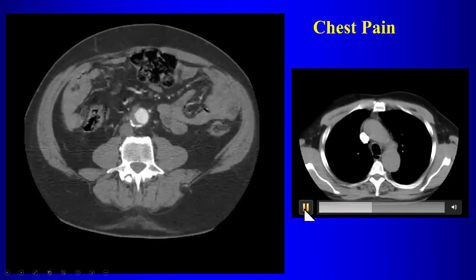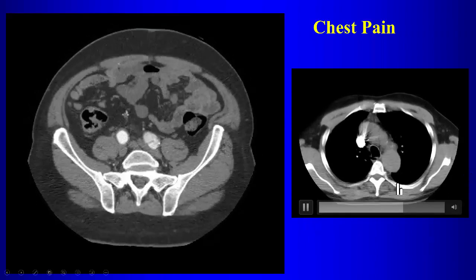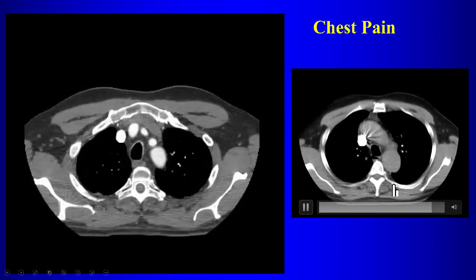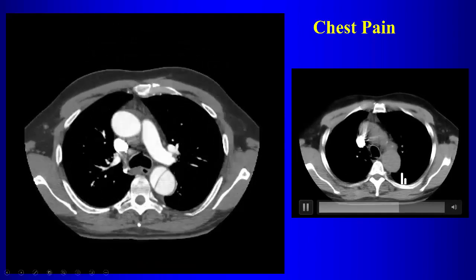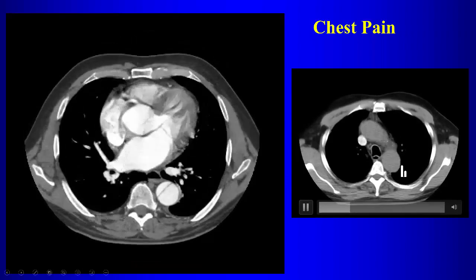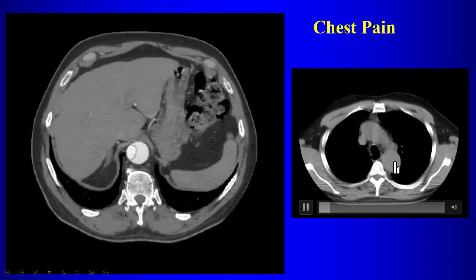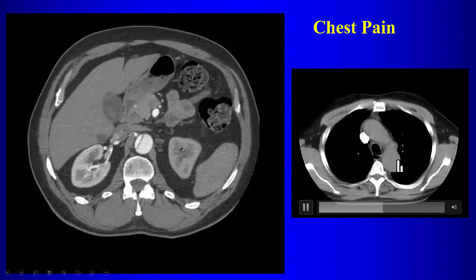Essentially, you take one slice location, you localize it, and then you decide on your vessel of interest, here the thoracic aorta, and put a region of interest around the vessel, either the ascending or the descending thoracic aorta.